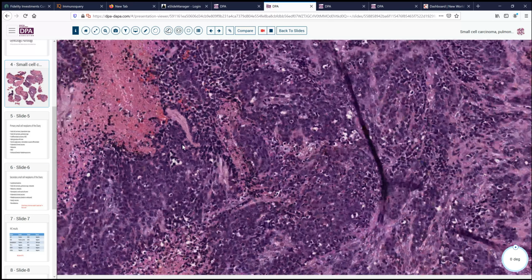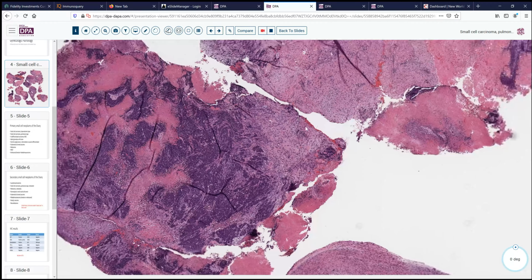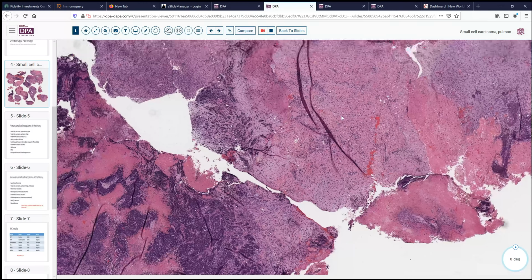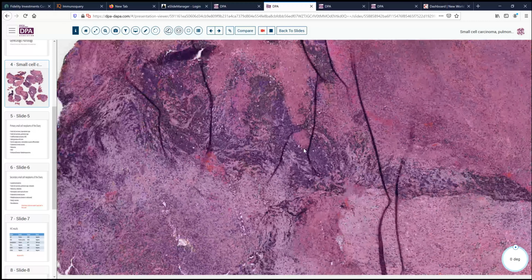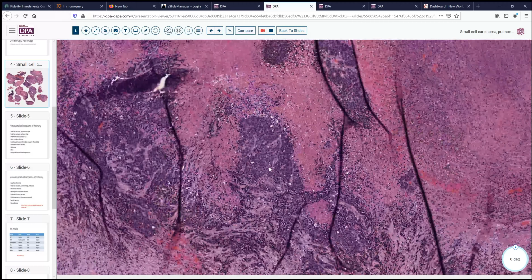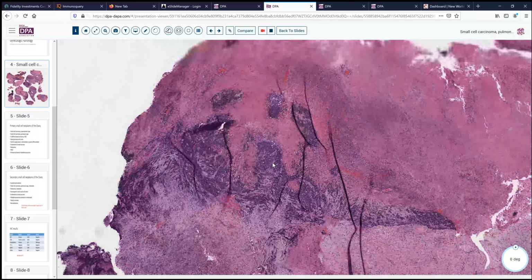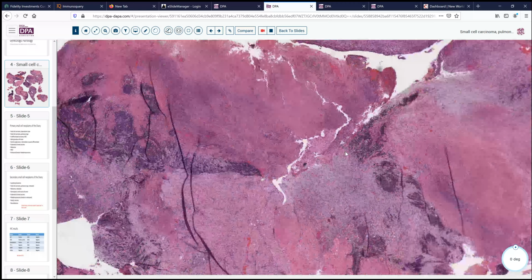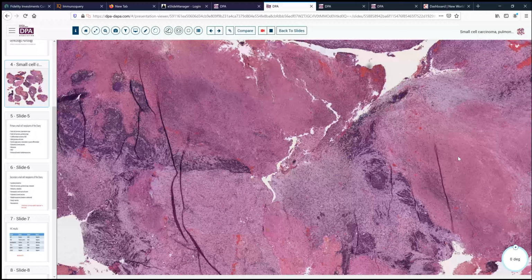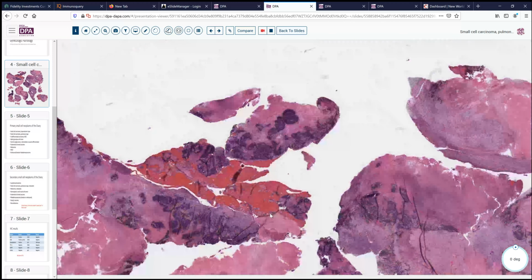And we can see also very frequent mitotic figures along with the activity of necrosis, tumoral type necrosis going on in the background. Of note, things that we do not see here are other identifiable structures, carcinomatous structures. We don't see any cystic changes, any follicle-like structures. We don't see a diffuse pattern of growth, so we see sort of chorded and trabecular pattern growth, with broad zones of necrosis far outweighing the areas of viable tumor.